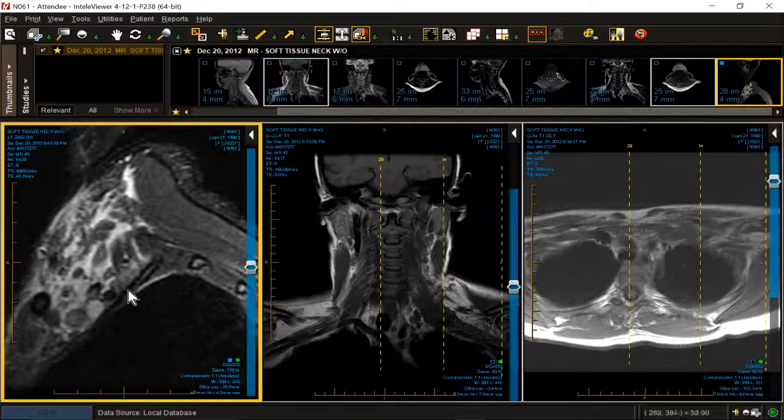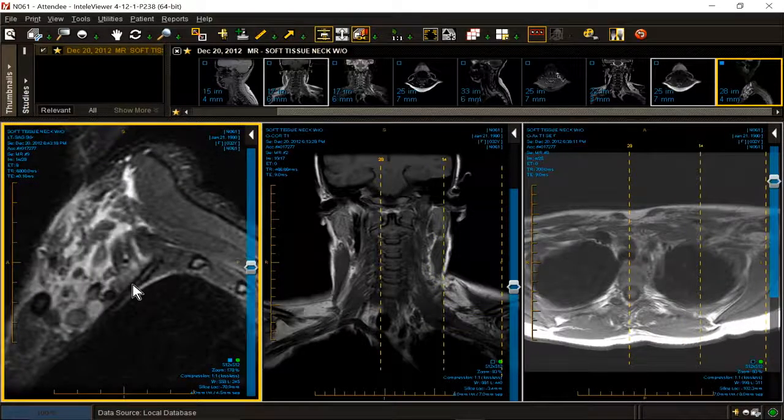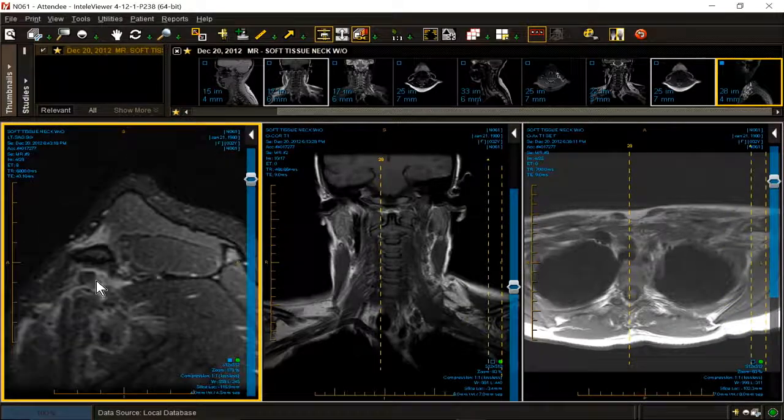So then just inside this triangle, you'll see some grayish-looking structures. They'll be seen in a pristine, non-edematous scalene triangle, but here they are. Here are at least 2 bundles of the brachial plexus. And then here is, again, your subclavius muscle.